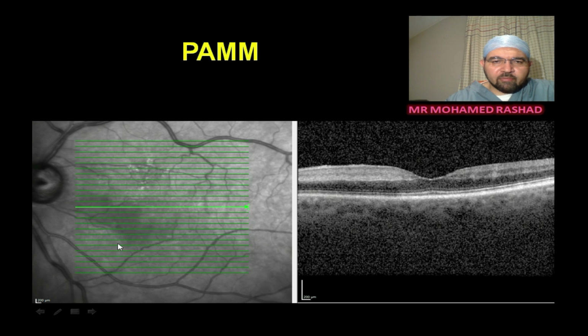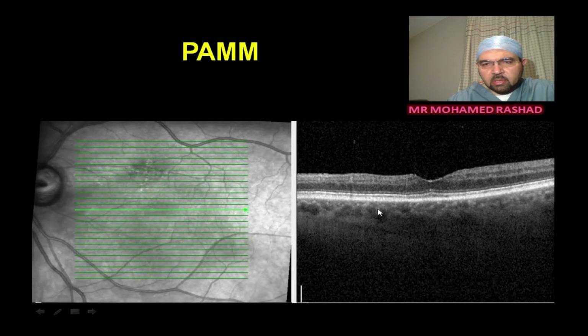On the fluorescein fundus angiogram there is no blockage, but on the OCT you can diagnose this condition. Here on the near infrared reflectance, you can see some hyporeflective areas that indicate this. After 6 months we find that the retinal layers that were hyperreflective are thinned. So you can identify here inner layer thinning, which is an indication of a vascular event that happened.